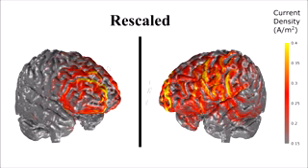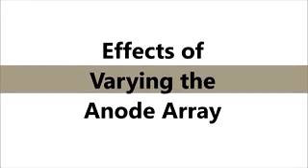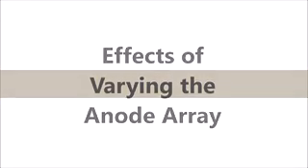The electrical brain stimulation distributes a low level of current over a wide area of cortex. The current is not uniformly distributed throughout the cortex. The highest levels of current are shown with yellow and the lower levels of current with red. The regions of the brain that are stimulated depend on the location of the electrodes on the scalp.